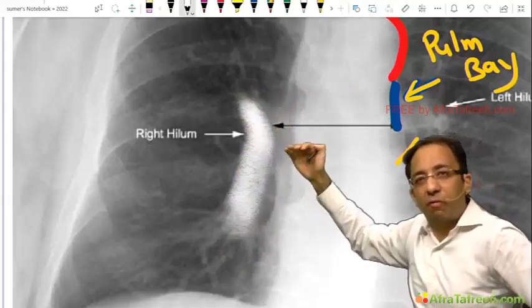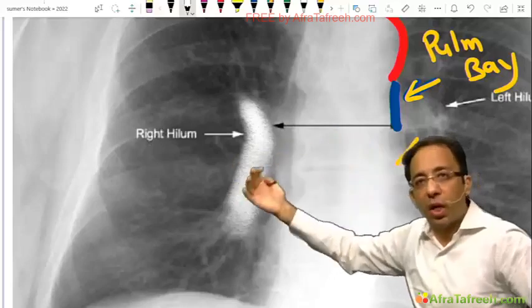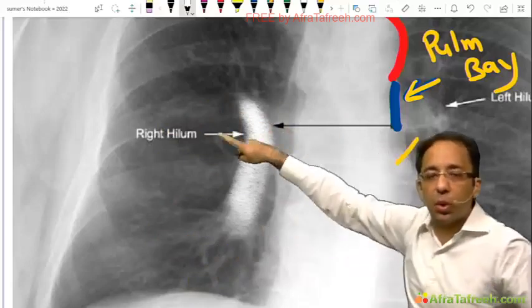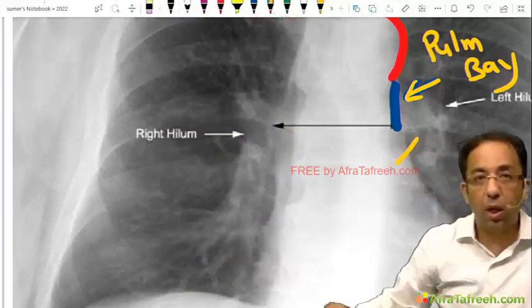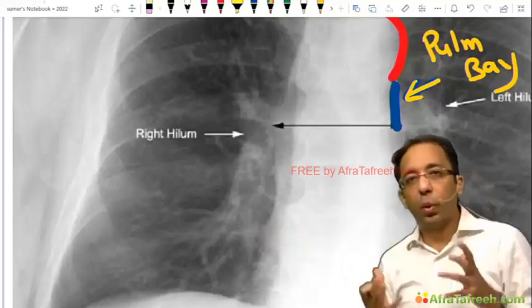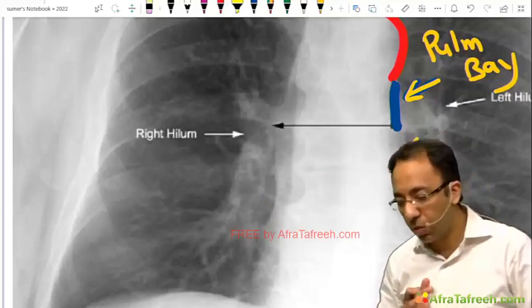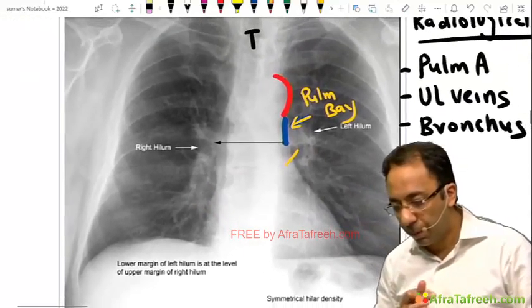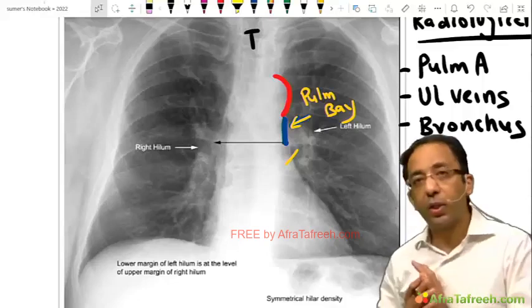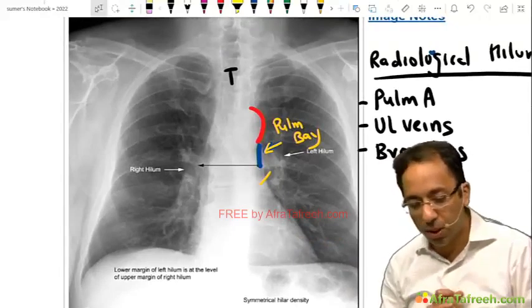And if there is a lymph node, if it is having a tumor or a lymph node, sarcoidosis, tuberculosis, you will see this will be bulging and enlarged. So keep it in mind. This is how the normal looks like. In the class, I will show you tuberculosis, sarcoidosis, different MCQs, but this is the normal appearance of the hilum. Okay, this is normal figure. This entire X-ray is all about normal findings. Arnav Jain, okay, all of this is normal.